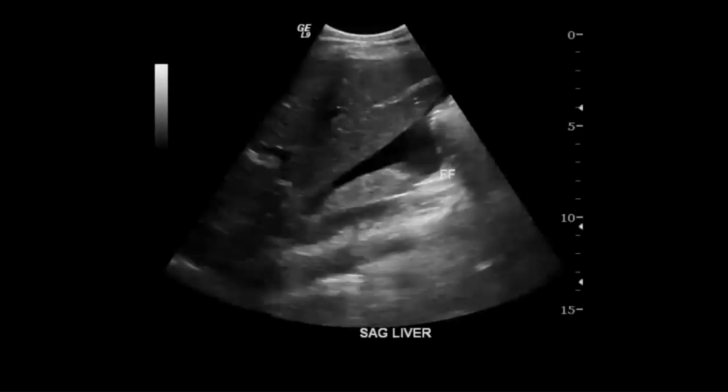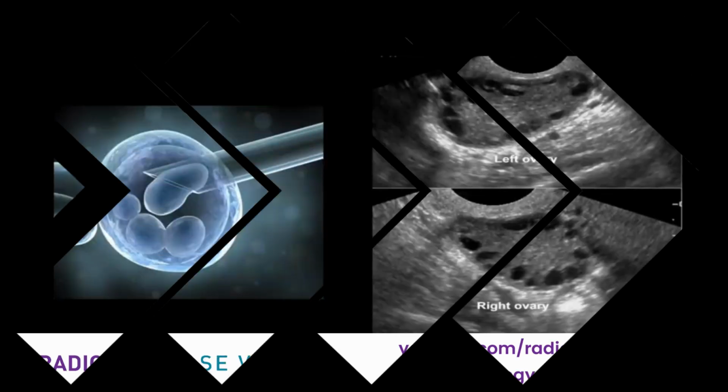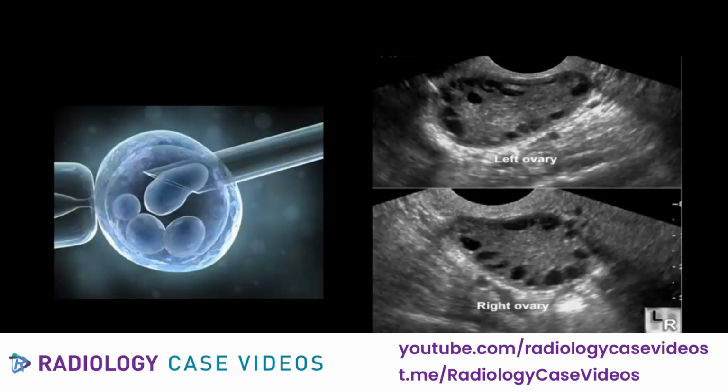The syndrome is relatively common, occurring in 5% of patients undergoing in vitro fertilization or IVF. There's probably an even higher incidence of the syndrome in egg donors due to their young age. So a few of the risk factors for OHSS are high baseline ovarian volume, background polycystic ovaries, low body weight, long ovulation induction cycle duration.